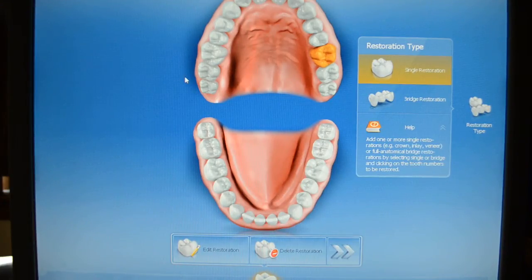And the third is biogeneric reference, and that's an occasion if we were working on tooth number 14 where if we really loved the way tooth number 3 looked, we could make the mirror image of it and build it. But today we're going to focus on biogeneric copy, and you may recall we use that about 30% of the time, and there are a couple big reasons we like to use it.